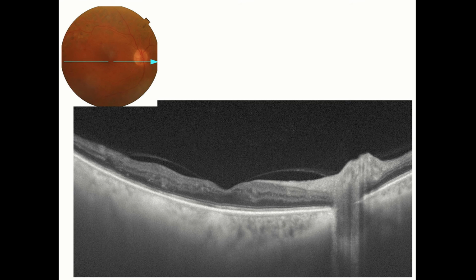Now looking at this patient, you can see this was a diabetic patient. These are focal laser scars. These are PRP scars. The reason to show you this picture is that this patient has got generalized thinning of the foveal layers, and there's diminution of different layers in this area. There's vitreomacular adhesion, and then you've got a foveal contour which seems to be of the normal depression, but the main thing, if you look at these layers, is that they are very small.